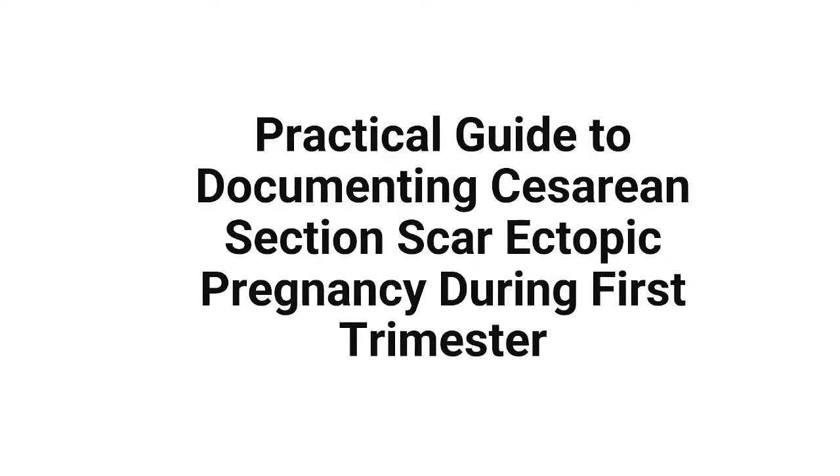So today we are going to talk about cesarean ectopic pregnancies. Nowadays, because of the prevalence of cesarean sections, the incidence of ectopic pregnancy is also on the rise.